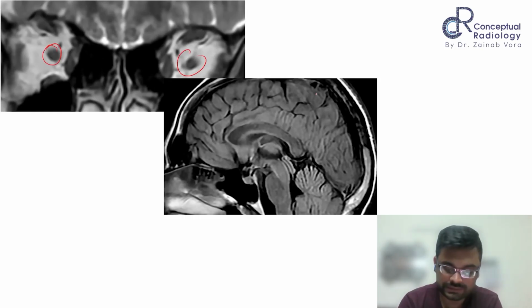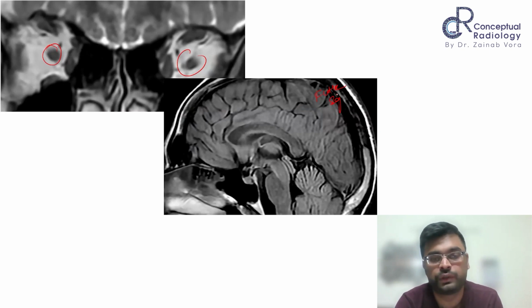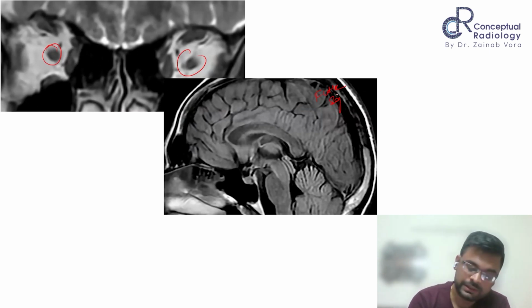And what is this? This is a FLAIR sagittal image. This is the midline sagittal. This section is very important when you are dealing with a case of demyelination, right? Why? Because this is the corpus callosum, and somewhere here is the septum pellucidum, and so this is the callososeptal interface.